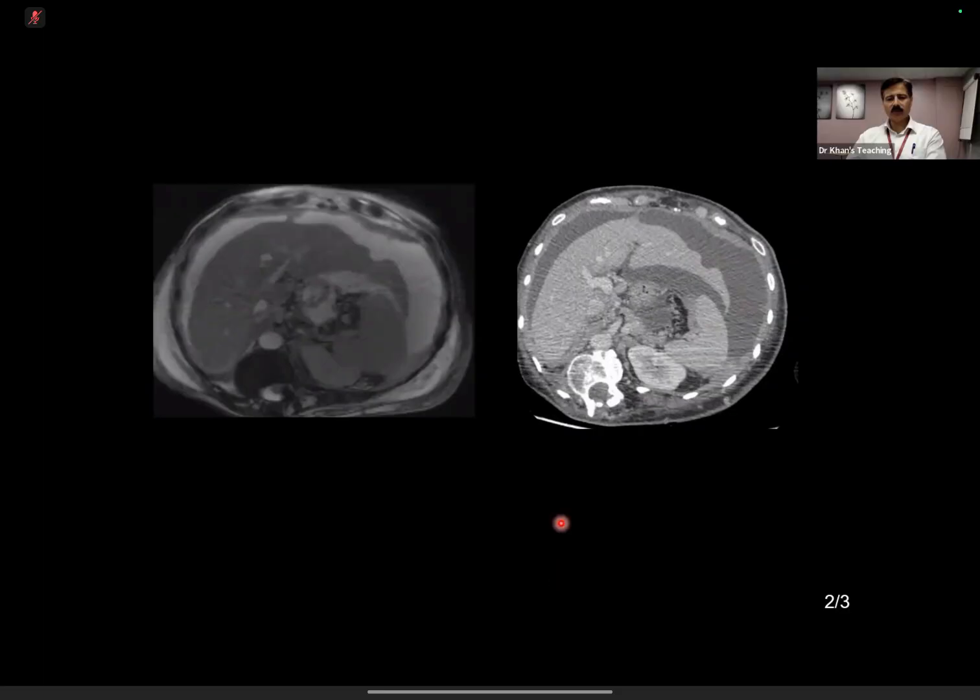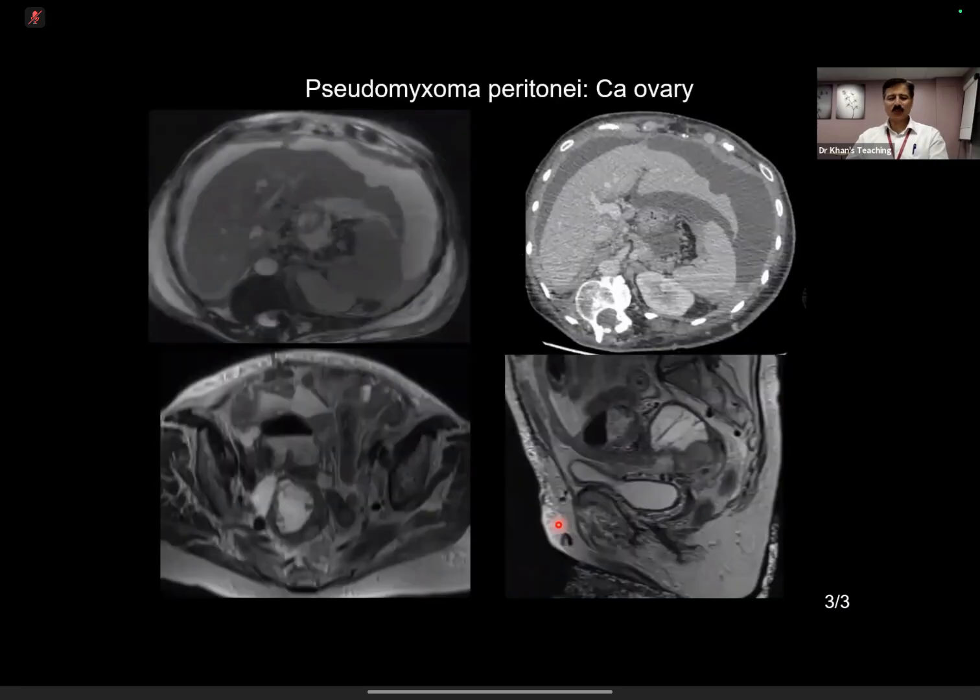There's a word which, anything comes to your mind regarding appendix or ovary and... Mucophyll, so it's... yeah, close, you're there? Okay, so the word is not coming to... There we go, pseudomyxoma. Here you are, I knew it. Yeah, good. Well done. So this is pseudomyxoma peritonei.